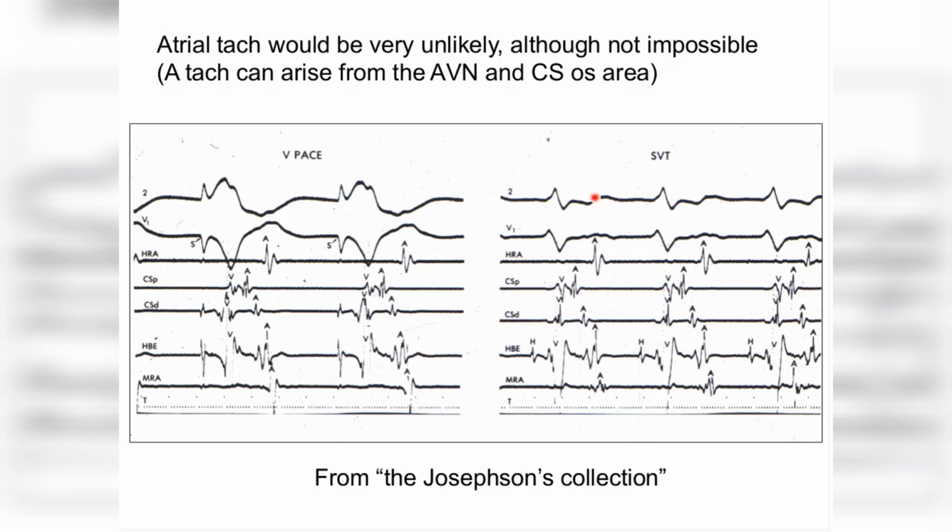So that means that there is a structure that is connected to the ventricle that produces an atrial activation sequence in the atrium identical as during tachycardia. So that makes it very likely that there is a structure at the AV junction participating in the tachycardia. And this will not be expected to be the case if the tachycardia was an atrial tachycardia.